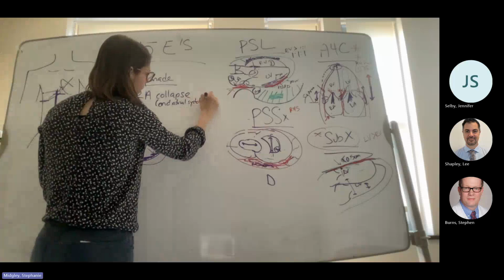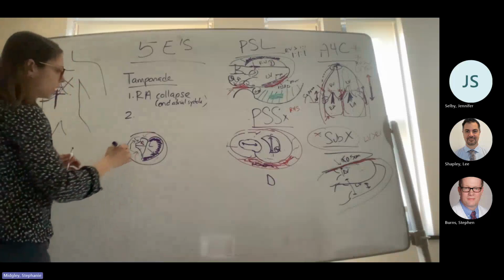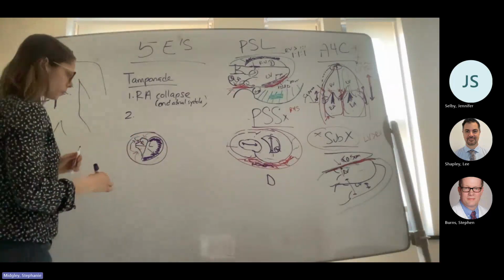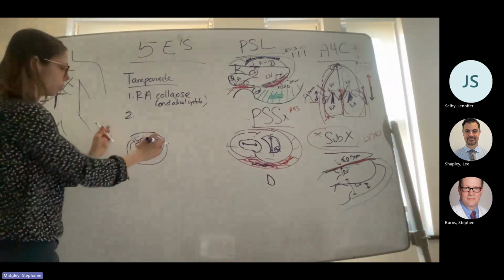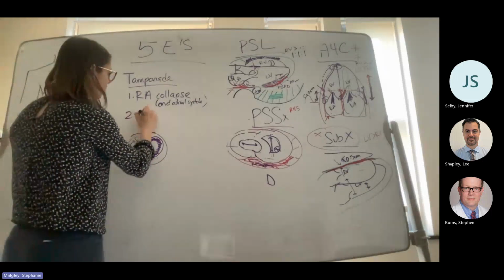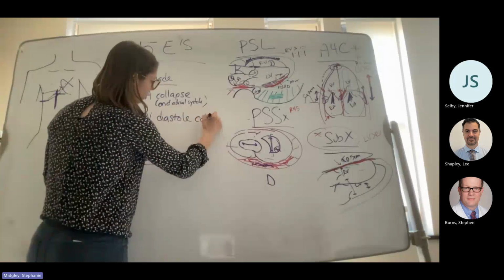It's a little bit hard to see. So this is like a very early sign. The next thing that's going to happen is as this starts to get affected, the right ventricle is going to start to get affected. And the same thing, the ventricle is going to get affected when it's at the lowest pressure. And so when it has the least amount of internal force to push against that fluid, which is going to be during diastole. So you're going to get right ventricular diastolic collapse.